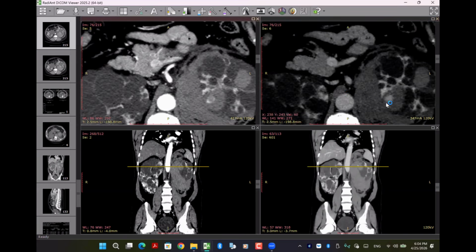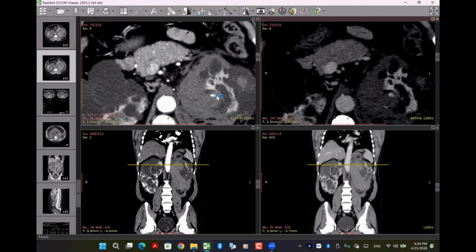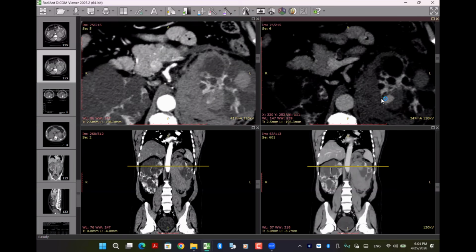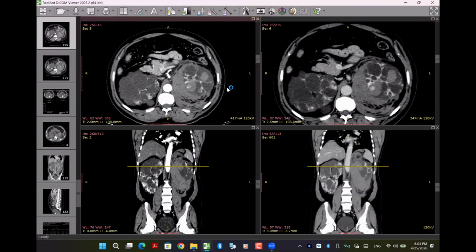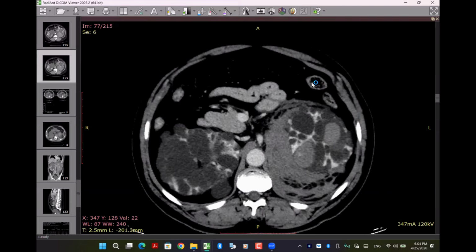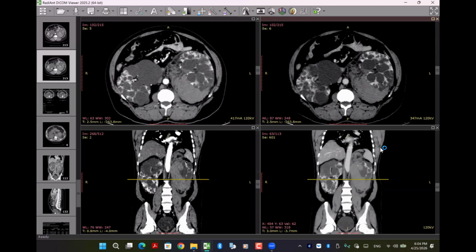Okay. What happened here? So there is the filling. This area showed persistent filling. Exactly, persistent filling. You can see this one. And this one is also persistent filling. So in order to manage this one, you will refer this case to which subspecialty? I will urgently communicate it to the interventional radiology department. Exactly. Now this study can change your management 330 degrees. You got my point?